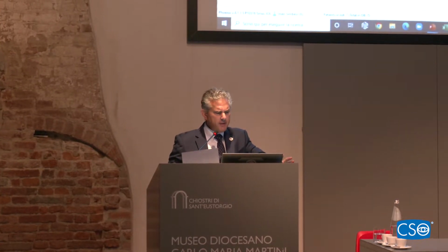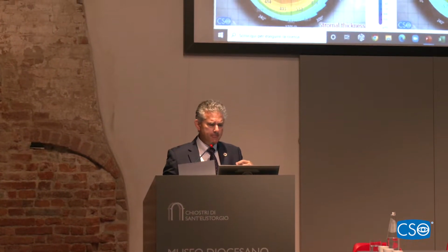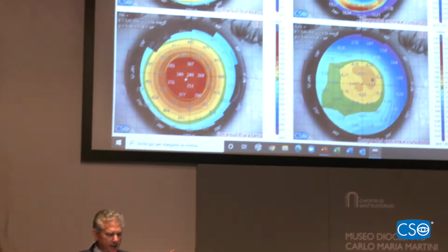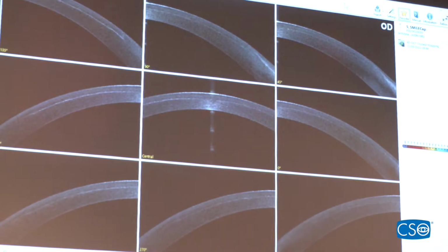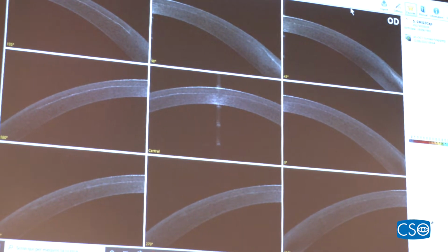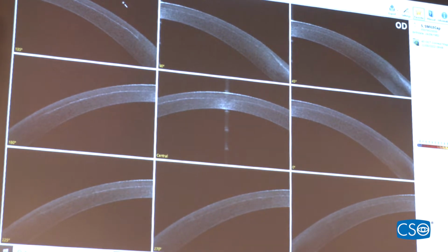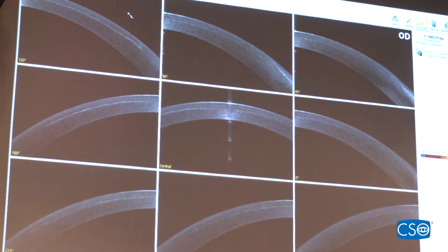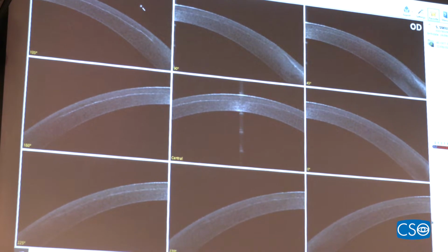Now I want to show you a couple of other things which I worked with Francesco to program here. This one is called the Reinstein cap display. With ultrasound, we've been mapping different layers for 25, 30 years now. But the OCT gives us a very quick, very easy way of getting an average idea of where the cap is in SMILE when we want to plan a flap on top.